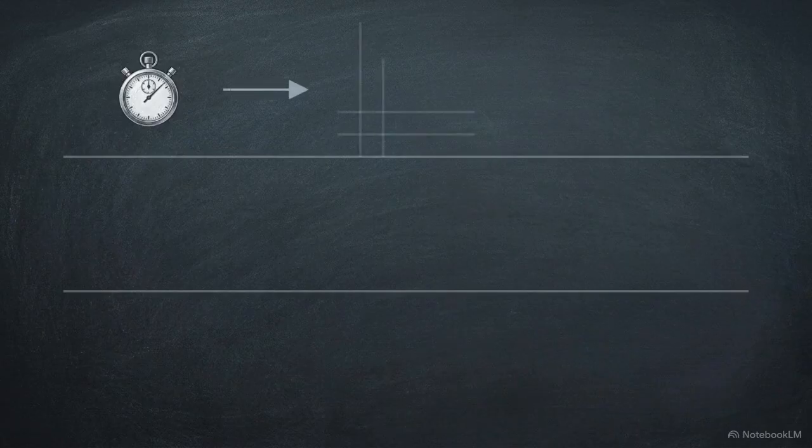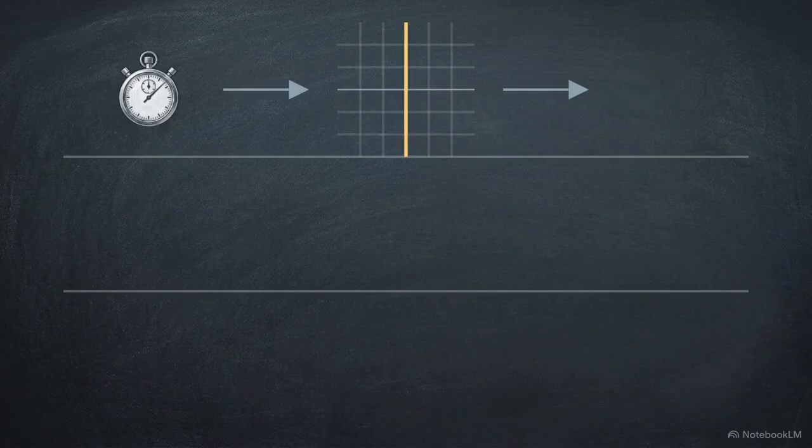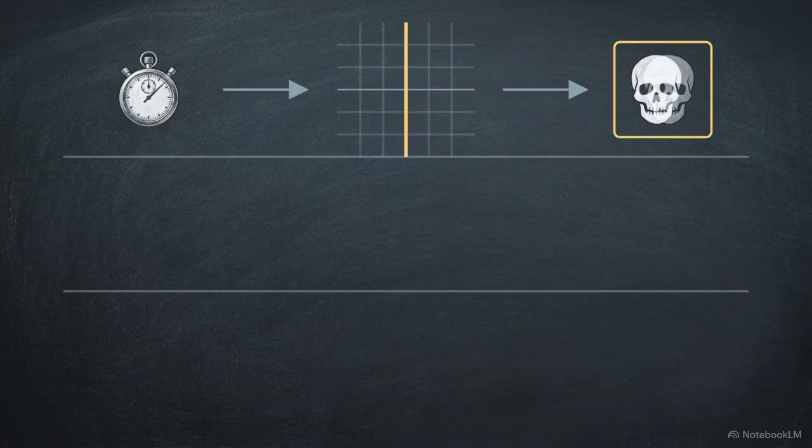Understanding these mechanisms provides a clear diagnostic framework. The physical source of an artifact can be reverse engineered by examining its mathematical geometry on the scan. Look at this matrix. Rule 1. If the visual error is strictly directional, the failure occurred in the gradient timing. Temporal delays along the slow phase axis result in ghosting or phase wrap.